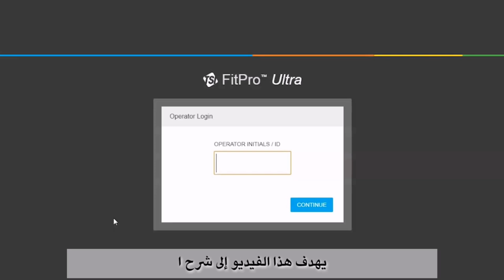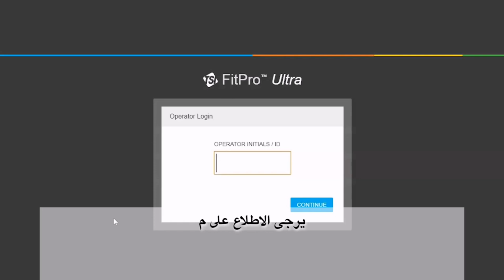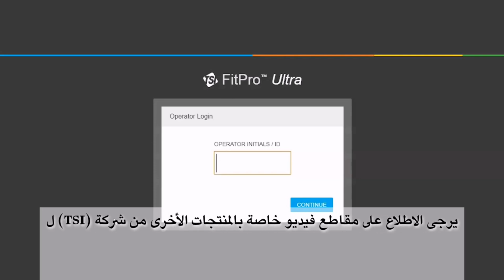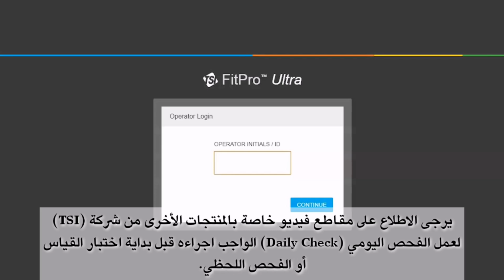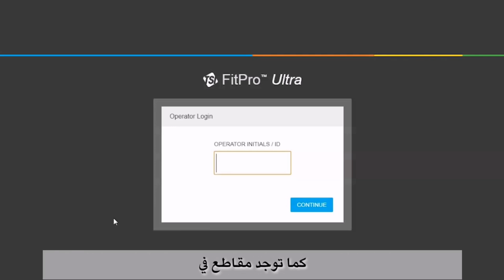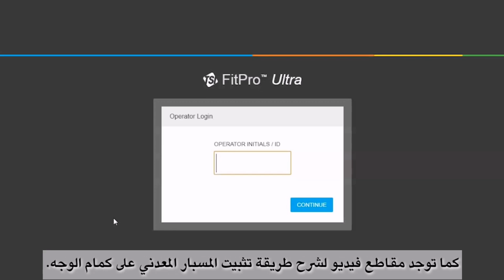This video is meant to show you the steps in the FitPro Ultra software only. Please refer to our other TSI training videos for instructions on how to conduct the daily checks with the 4th generation PortaCount, which need to be done prior to fit testing, or on how to conduct a live fit test. We also have product training videos for how to probe a filtering facepiece respirator and setting up half and full face elastomeric respirators with mask sample adapters.